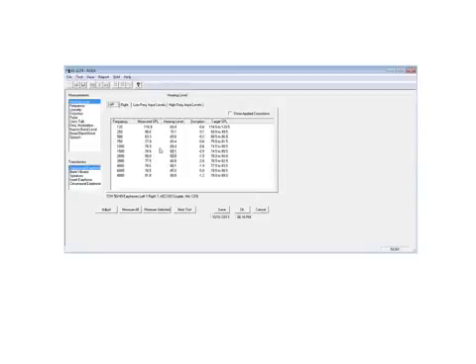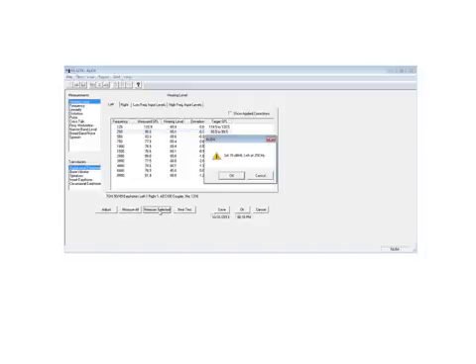As we look at the hearing level, if we use 250 hertz as an example, as we select that, we can measure selected. As we hit measure selected, the software prompts us to set up the audiometer now, turn the dial to 70 dB hearing level, and set the frequency at 250 hertz.